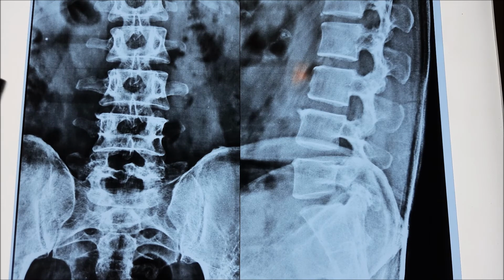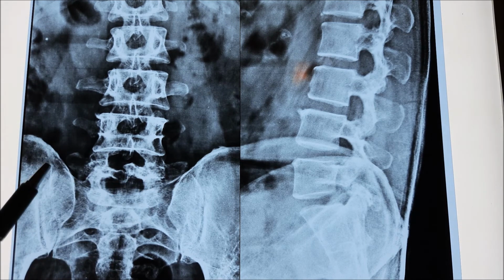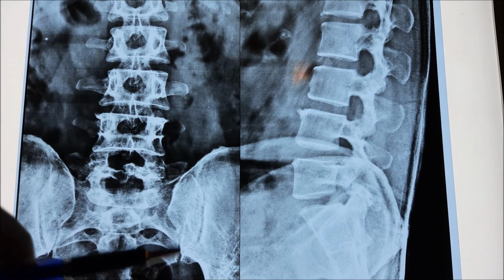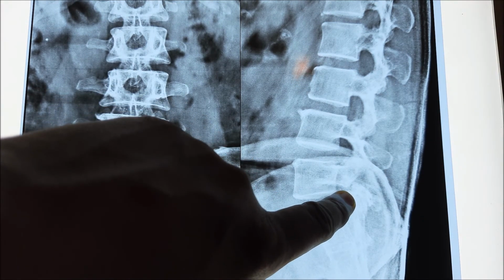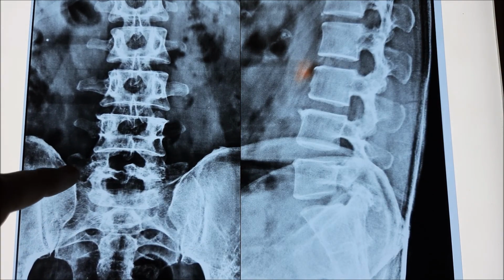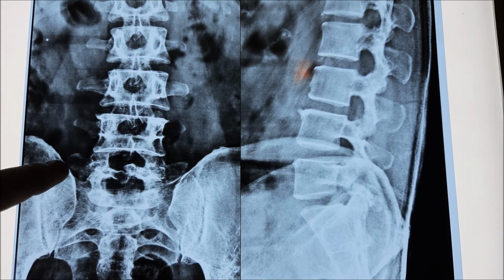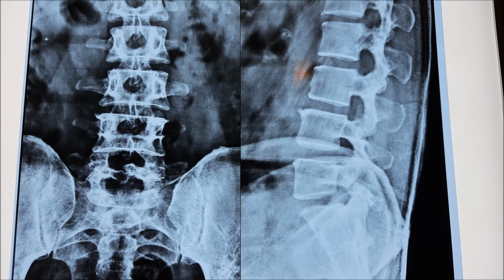So this is the L5 vertebral body. When the L5 transverse process bilaterally is about to get fused with the iliac crest, it's called sacralization. The L5 vertebra, lumbar sacralization. It's about to happen. So for this person, there are three findings. From the lateral view, one is the grade 1 spondylolisthesis. From the AP view, we can see the spinous process fracture, and we can see the transverse process which is about to touch the iliac crest, and that's what is called sacralization.